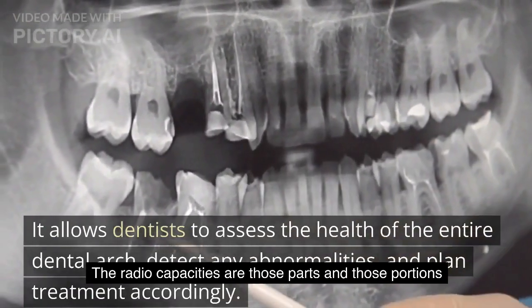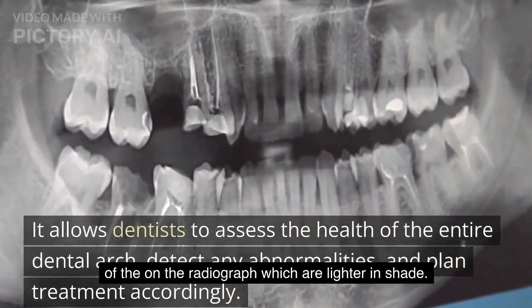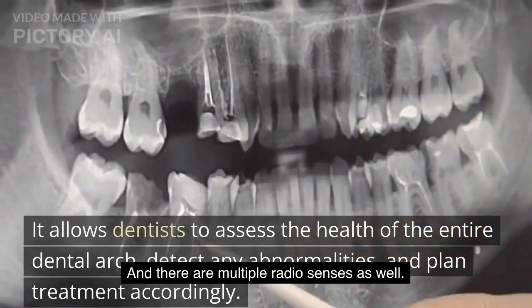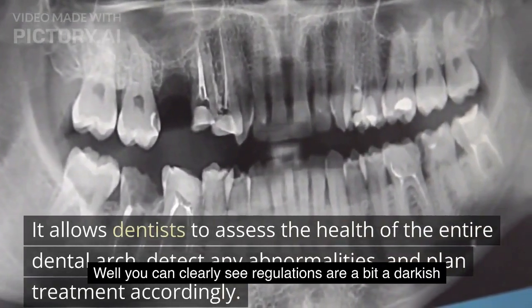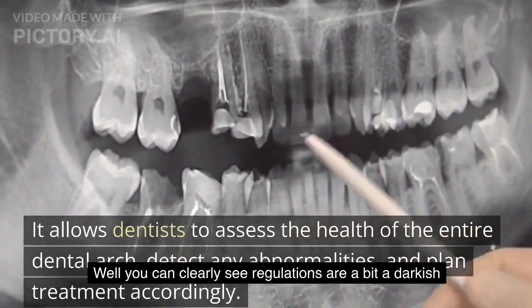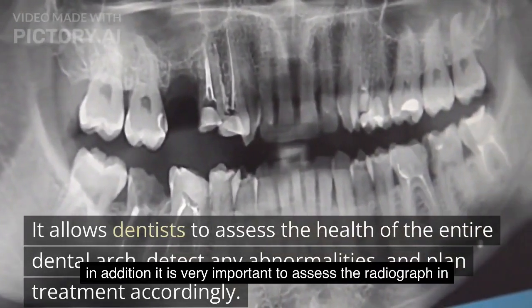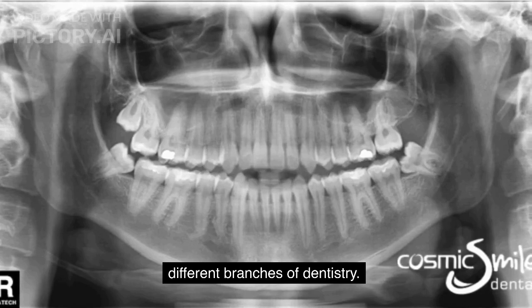In this radiograph you can clearly see multiple radiopacities. The radiopacities are those portions of the radiograph which are lighter in shade, and there are multiple radiolucencies as well. You can clearly see radiolucencies are the darker parts of the radiograph. In addition, it is very important to assess the radiograph in different branches of dentistry.